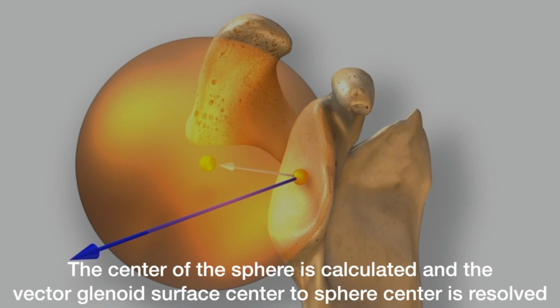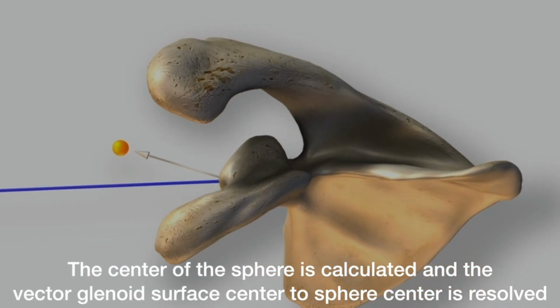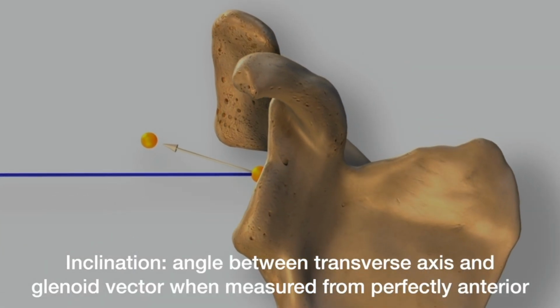If we look straight from superiorly, whatever angle can be measured between the transverse scapular axis and the vector that connects the center of gravity of the glenoid with the center of the best fitting sphere is your version. If we look at the scapula straight from anteriorly, the angle between the transverse scapular axis and that vector that again connects the center of gravity of the glenoid with the center of the sphere will be your inclination, superior or inferior.